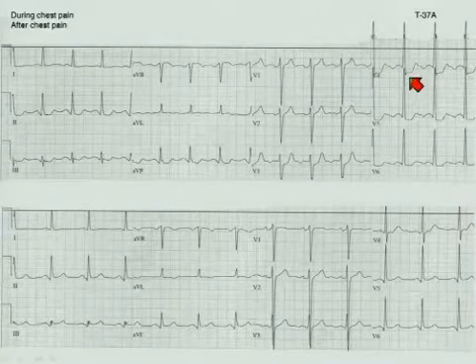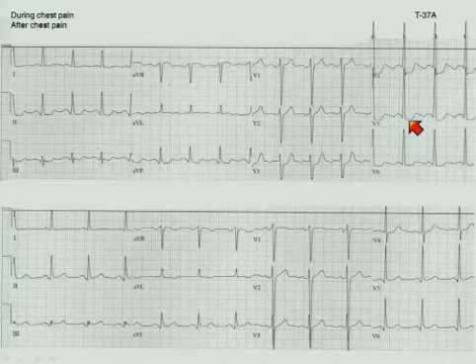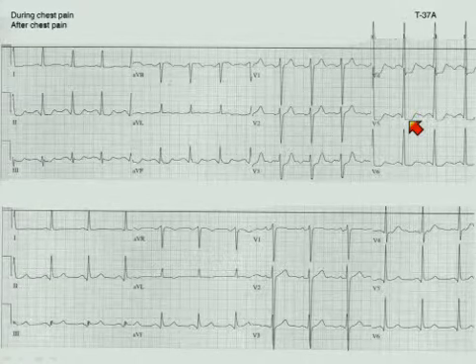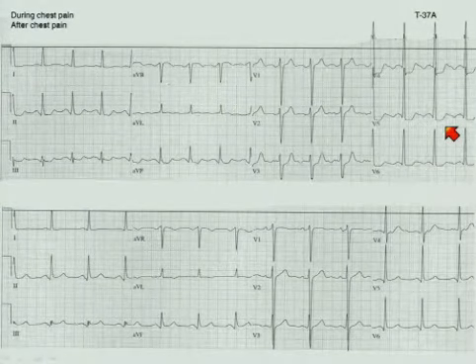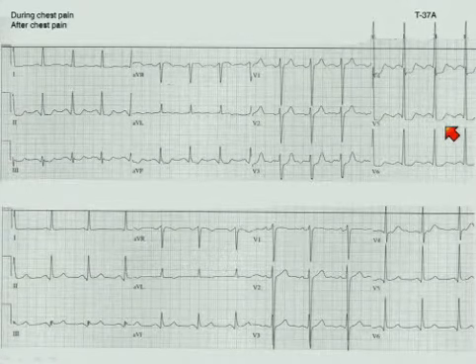You notice that there is ST depression, what we know, part and parcel of acute ischemia, whether it's on a treadmill or spontaneous. But look at this. What is this? Those are negative U waves. Negative U waves can be indicative of ischemia as well. On the treadmill, when they occur, the development of acute negative U waves is usually indicative of a left anterior descending coronary lesion.